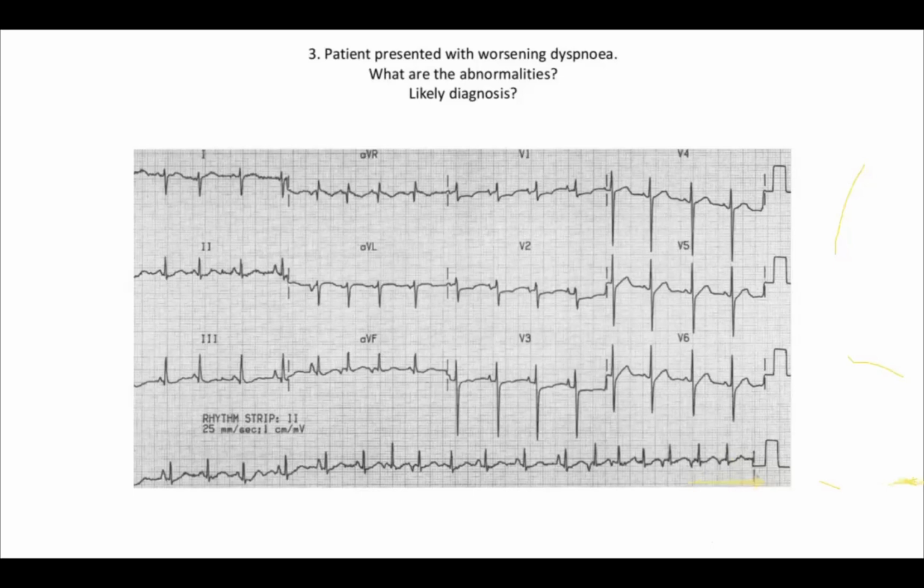This can be pulmonary embolism, right? But you don't see good T wave inversions here. But you have to always think about pulmonary embolism. Good. And what else? What are the other changes here? Very good. So V1, V2 ST depressions with right axis deviation show there is some RV strain, right? So again, it is more suggestive of some sort of sudden RV stress. What else? There's another thing here.